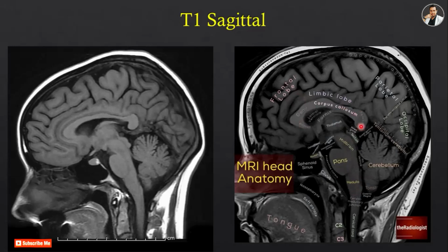This is the corpus callosum. This is the genu. This is the splenium.